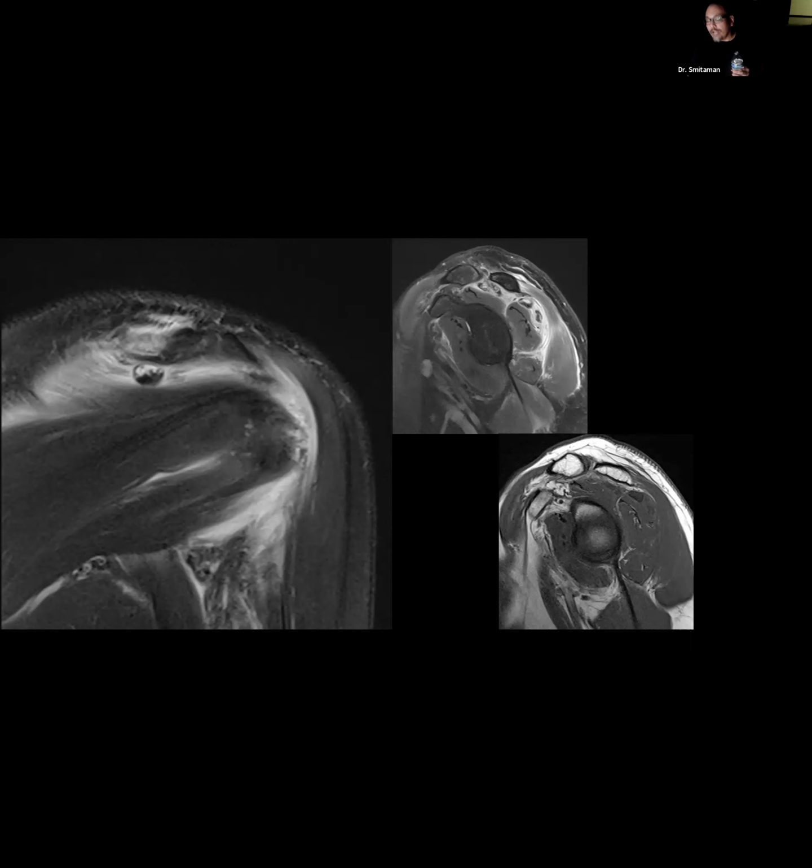Whatever terms you use, though, I highly recommend that you communicate, keep that open dialogue with your clinician so that we are all on the same page. But this, as you can see, was a case of basic calcium phosphate tracking within the supraspinatus, okay, and more so the infraspinatus muscle, causing a robust myositis. And this patient actually came in for rule out either trauma or infection, which is the typical case for these cases of basic calcium phosphate with muscle extension.